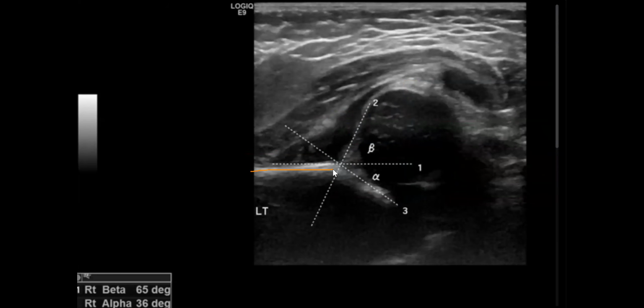This is the ilium. What about the bony acetabulum? It should be here. Shallow acetabulum, very shallow. What about the triangular shaped labrum? It's deformed, everted. What about the femoral head? It's out from its socket. If we do a femoral coverage ratio, more than 50 or 70%, for example, is outside its socket.